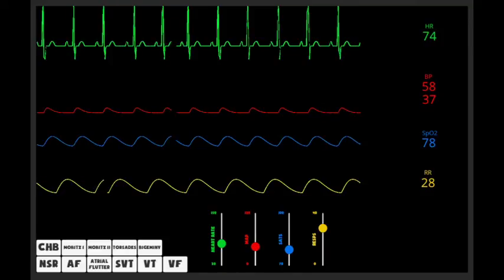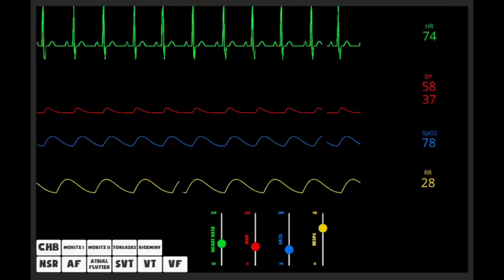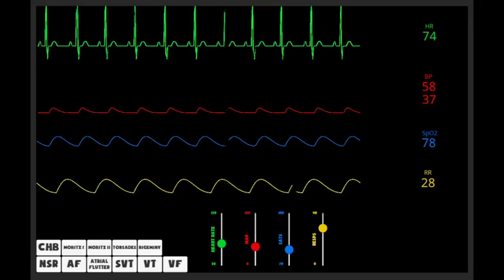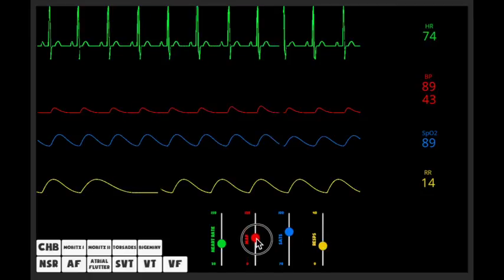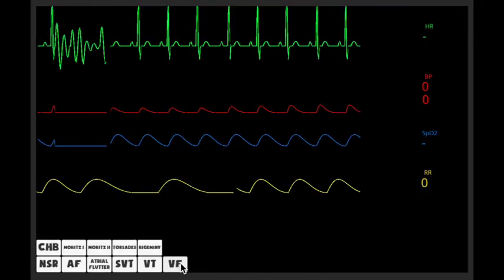And meanwhile, you can sit off to one side, load this app on your tablet or smartphone, and you're in complete control of the patient that your students are looking at. So say they hook up some oxygen, you can put up the sats here, maybe drop the respiratory rate a little bit. If they hook up fluids, you can push the patient's blood pressure up. Or if they don't, you can put the patient into cardiac arrest and let them deal with that.